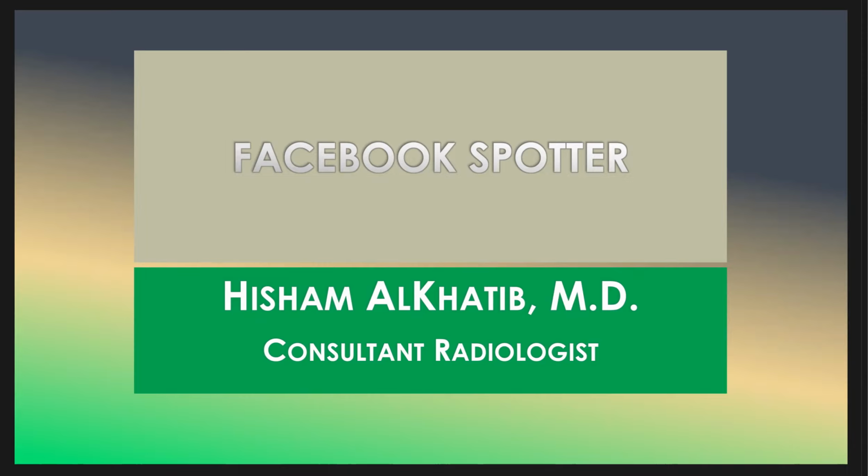This is the 50 case of pediatric imaging spot cases, and I will give some seconds and try to answer, and I will answer each case after the presentation.